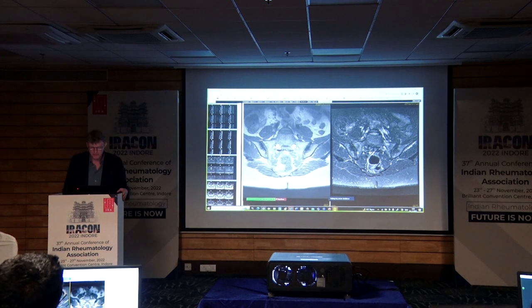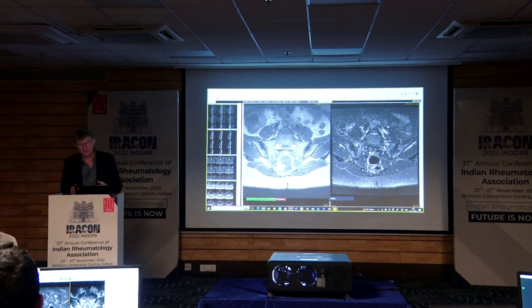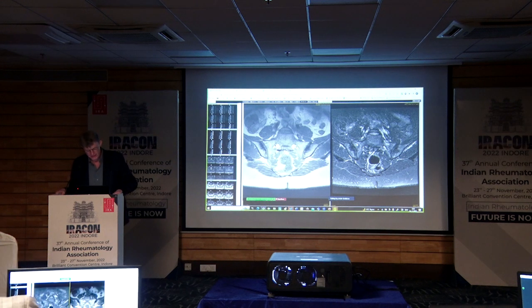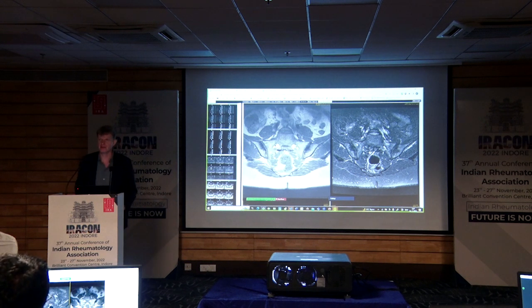So I would say that there is a bit of bone marrow edema, you can say here, and that is what you often see in osteitis condensans. The Berlin group made a study where they looked at it together with actually SpA and found that the far majority, about 80%, have some bone marrow edema when you have osteitis condensans. It also makes sense when you have a condition called osteitis. Then you more or less need to have just a little bit of bone marrow edema on MRI to make that name reasonable. That's not an argument, but you sometimes see it.